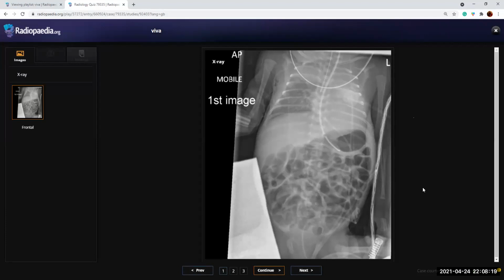So anything else you can see in this X-ray? Even the left hemithorax appears opacified, and I cannot see the cardiac silhouette very clearly. There is a rounded opacity in the left hemithorax in the midzone, but I think that's a chest lead. No, that's a chest lead, yeah. So basically, I would compare with the clinical history of the patient, whether the patient was a preterm or a term patient, and whether there was any kind of meconium aspiration. No, there was no such incident reported.